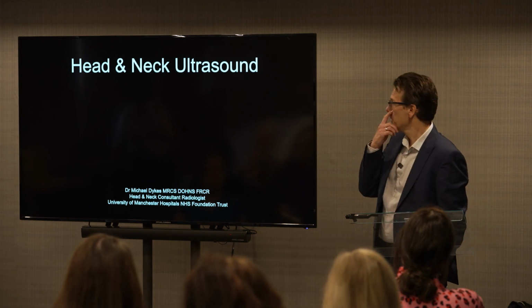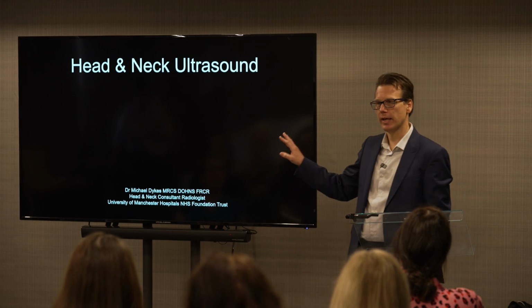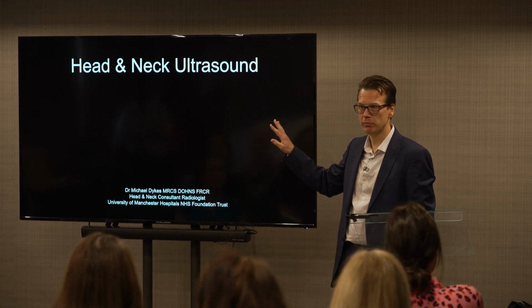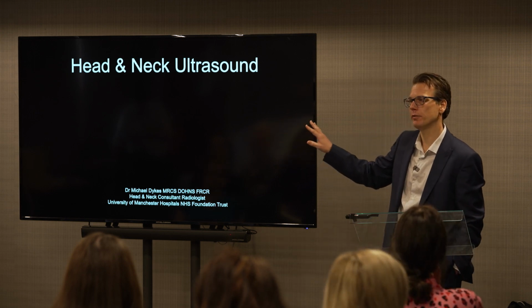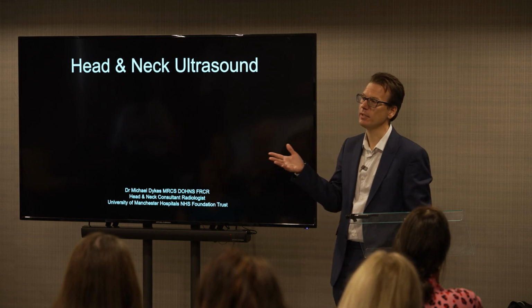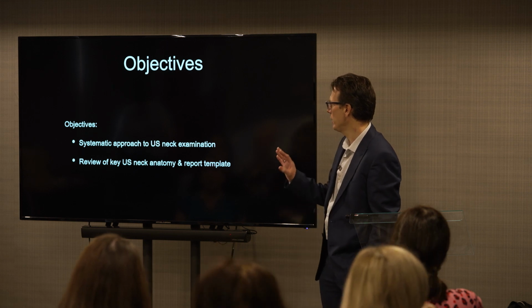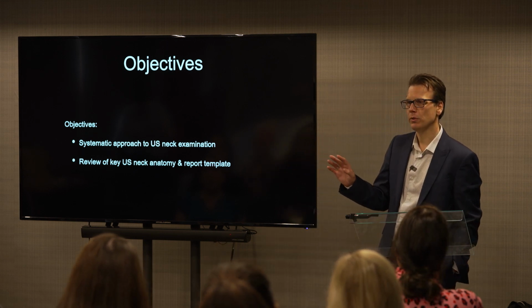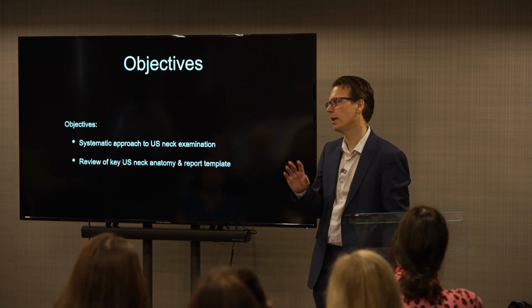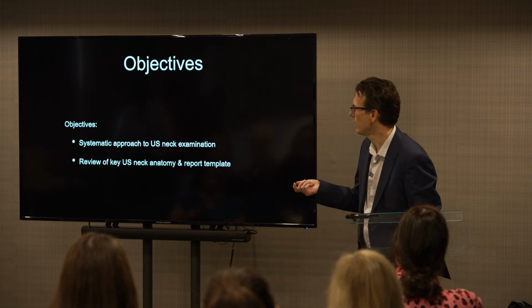So, morning everyone. First part, I was just going to show some slides, some typical ultrasound images that I take, even if it's a normal appearance of that particular region of the neck, that I would take an image of, just to document that it's normal. And we'll go through some of the anatomy so you can orientate yourselves. At the end, I don't know if any of you document or formally record anything in patient notes about what you've seen, but I'll show you my template for normal, just as an example.